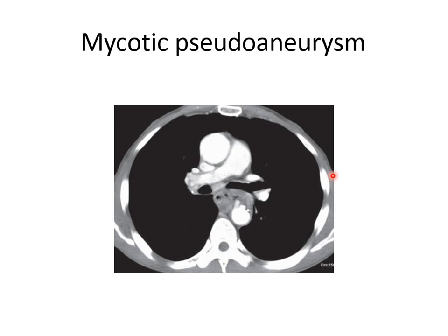The important thing is it causes thickening of the wall. Maybe we can see gas in the wall of the aorta, and ulceration. Here, this is a CT angio showing the descending aorta having an irregular lumen with ulceration, thickening of the wall, and even bubbles of gas in the wall of the aorta. You can see that the anatomical plane between the thickened wall and the esophagus is not clear, so it extends to the nearby structures.